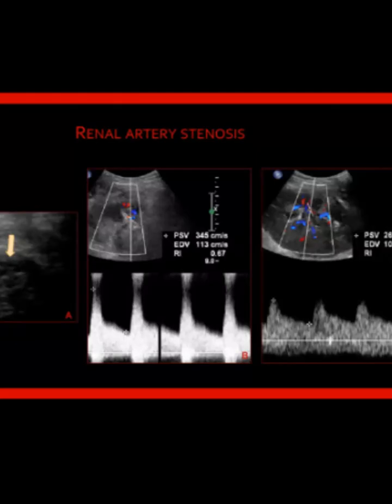At the anastomosis site, the radial artery sends blood to the hand. Normally there are too many capillaries and palmar arches, so there is high resistance. Once directly connected, the blood comes to the venous segment of the arteriovenous fistula, and you know that the pressure in the right atrium is zero. So the pressure in the vein is zero. So the resistive index is quite decreased in an AVF as compared to the distal vasculature of the hand. Similarly, in renal artery stenosis, the resistive index is decreased due to too much vasodilation from ischemia.